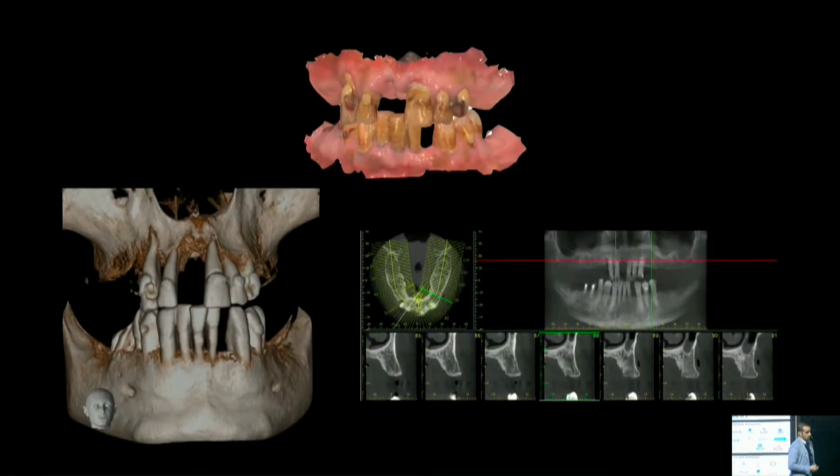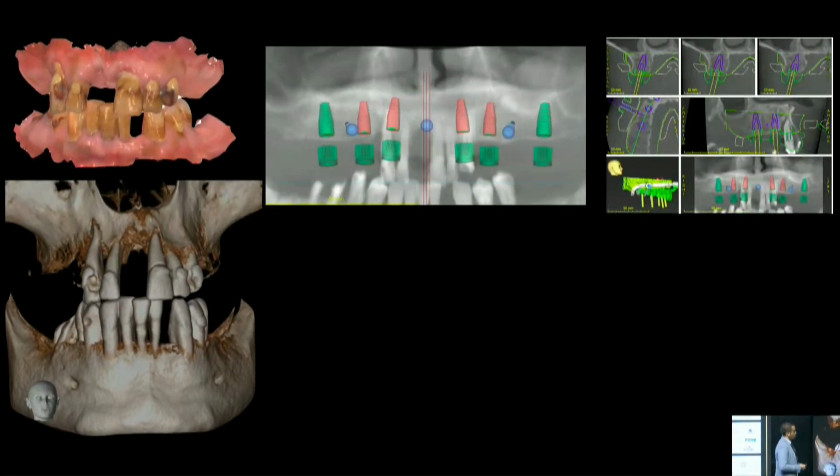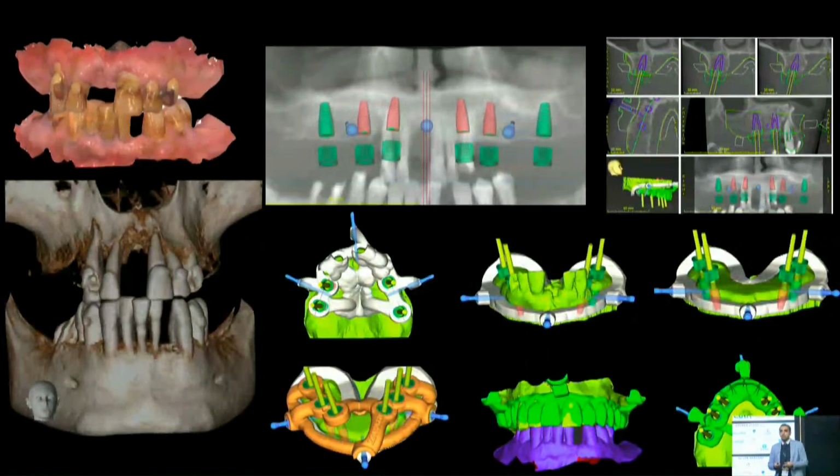Now, we send the patient for a CBCT scan, so now we have everything we need to start our treatment. We can use software to merge data from the DICOM files and the STL files from our intraoral scanner. In this case, I used coDiagnostiX. So as you can realize, we no longer need a radiographic stent because we can simply do this step digitally. Not only can we design our surgical stents, we can also design the interim prostheses that we are planning to immediately load.